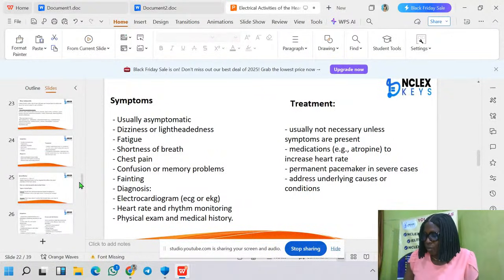Your response. Is this P wave looking like a normal P wave? Like the class is dull. You people are dulling my spirit too. You are not responding on time. I don't know whether you don't understand what I'm saying.